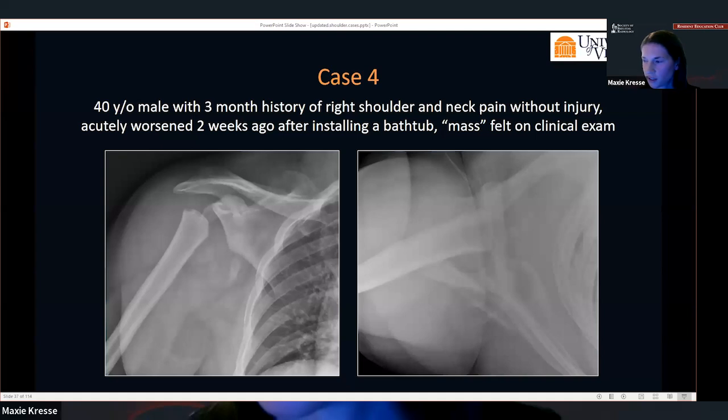All right, got an answer here. Yeah, this is definitely abnormal, right? This is one you look at and just think, not a lot of it looks normal here. Almost the entire humeral head and neck is gone. You have this surgical-like margin, you have this ossific debris, and there's a little remodeling of the glenoid and some subluxation here.